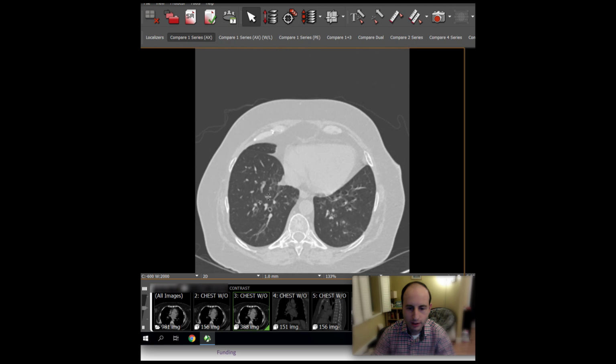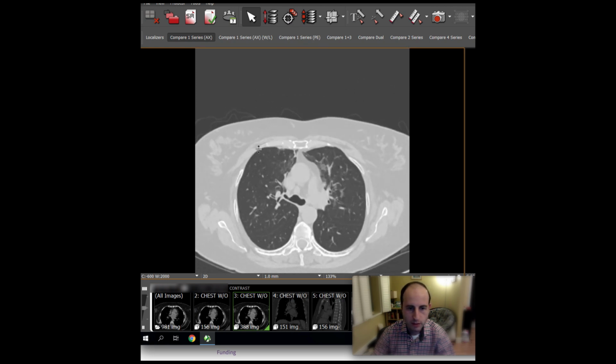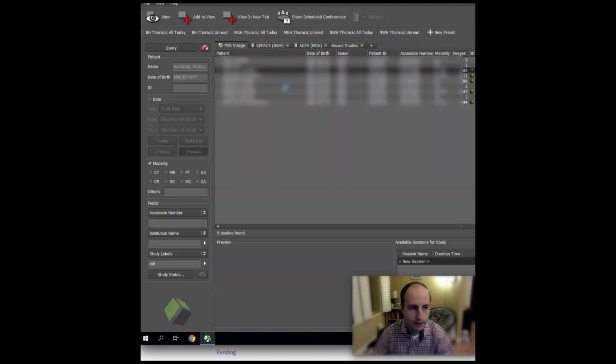So I don't think you could necessarily conclude much. This case is a case of human metapneumovirus pneumonia, which again, in the current era, in an area that is experiencing an epidemic, you might wonder whether people would suggest that this was COVID. If you didn't have a test available, there's no way you could really know for sure.